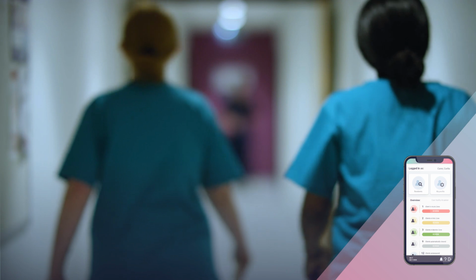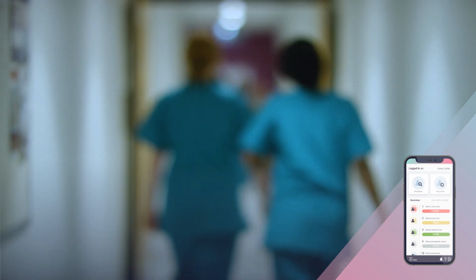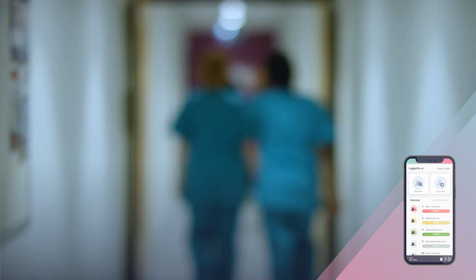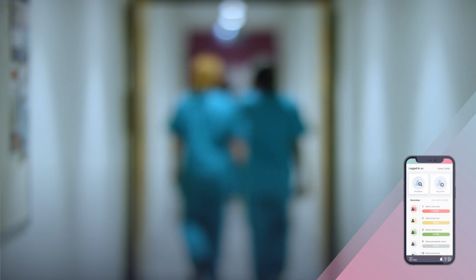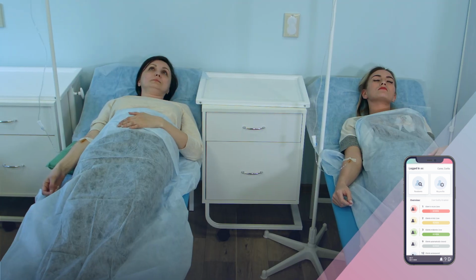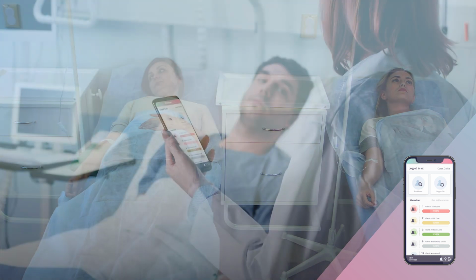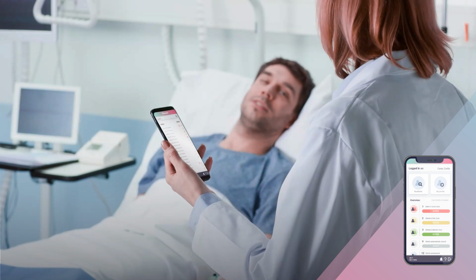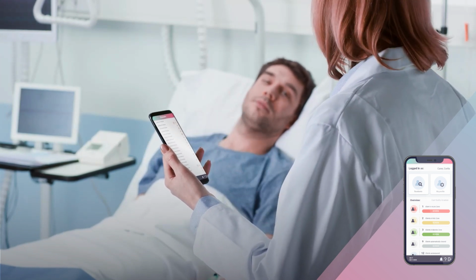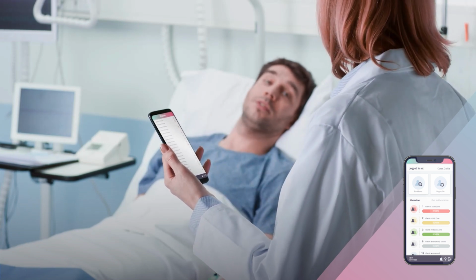Due to its flexible deployment, Vitacam Care can go where traditional solutions cannot. The application can be used as a portable measuring and recording device for a variety of purposes, such as hospital ward rounds and portable clinics, assisted living, and early screening purposes. The processed results are returned to the Care application for viewing. Depending on the configuration, results can also be written directly to patient record.